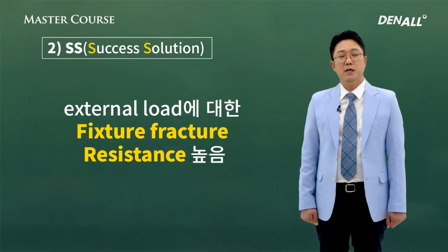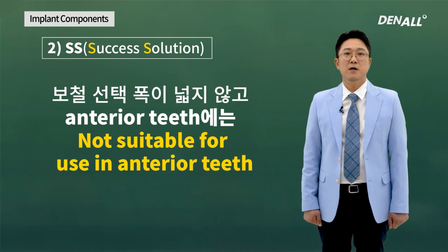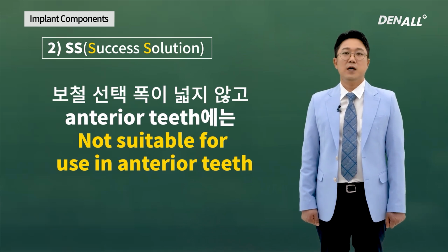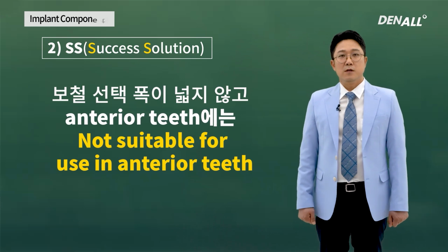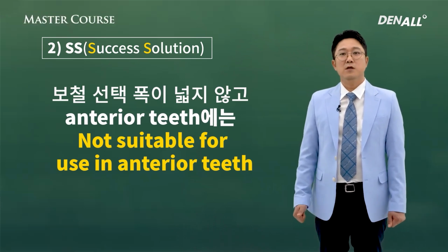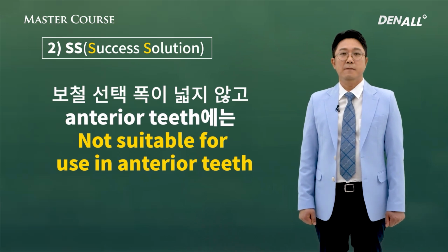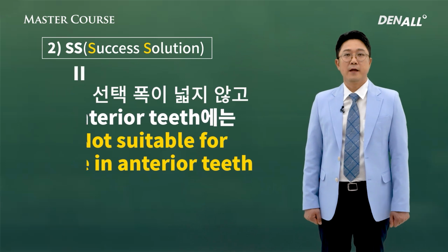fracture. However, the cuff shape of abutment is already fabricated along with the fixtures, so abutment shape cannot be adjusted. Therefore, when you make prosthesis, especially in aesthetic anterior area, it has limited usage.